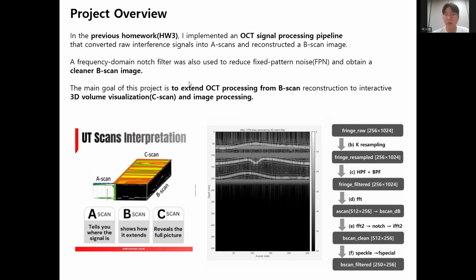So the goal is not only to process one image, but to build a software platform that can explore and process a 3D OCT style volume.